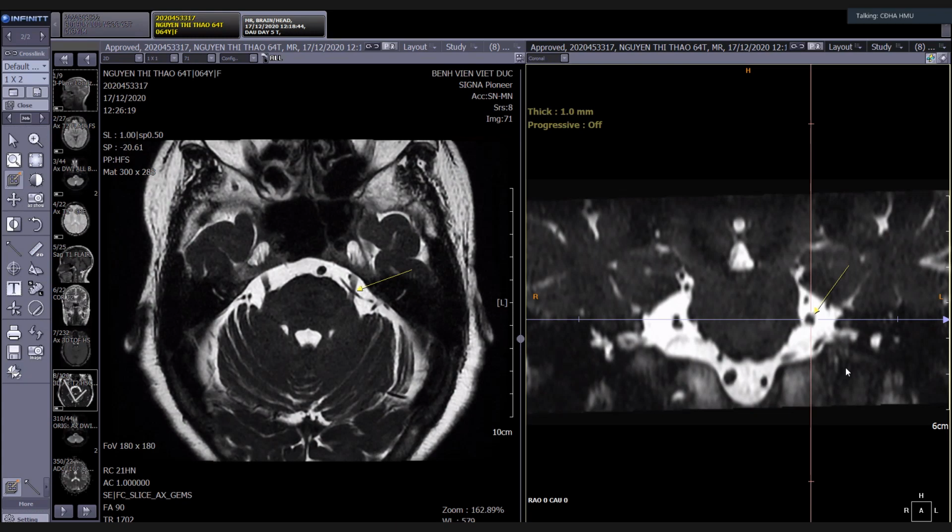So in clinical practice, when you do an MRI for neurovascular conflict, you have to know about the patient's symptom, right? Whether it is on the left side or the right side, and whether it is a symptom of the facial nerve or of the trigeminal nerve. This is the first one. The second one is you should do an appropriate protocol, which must comprise at least two sequences: the CISS or 3D steady state sequence, and the second one is a TOF, right? The TOF.